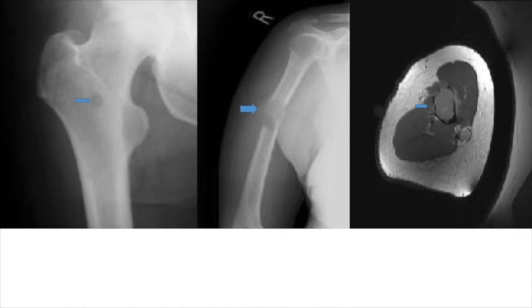The other pathologies related with multiple myeloma include all kinds of lytic lesions. You can see this in the picture at the left. This lytic lesion over there is a loosened area. In the second, it looks like something is eating the bone. That's another example of this horrible disease.